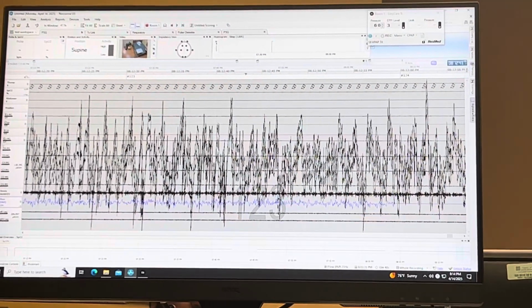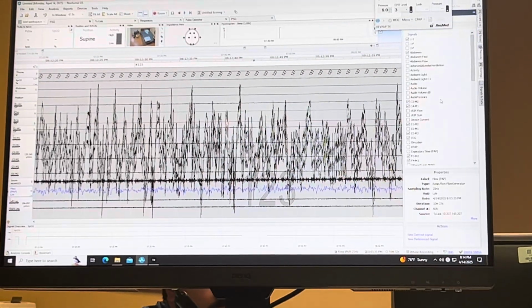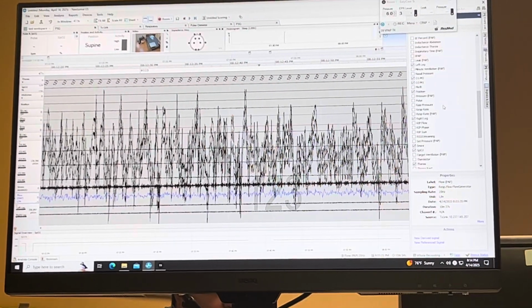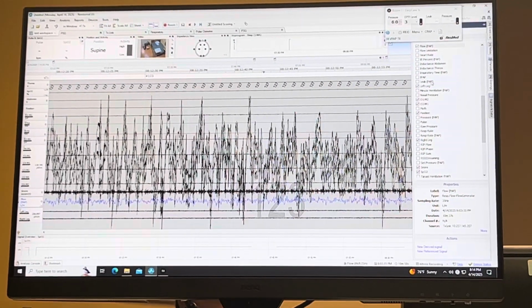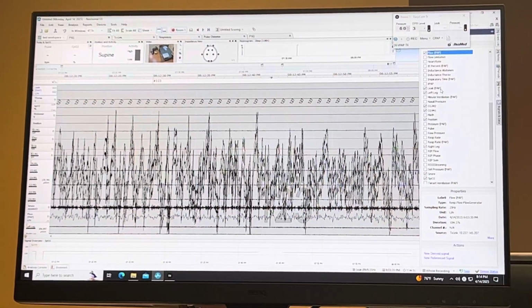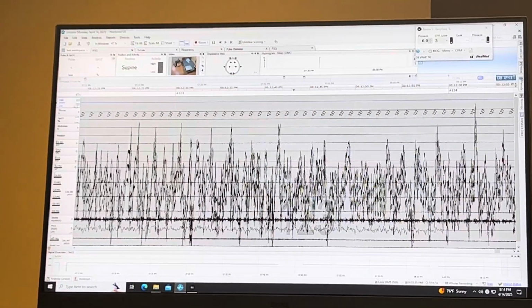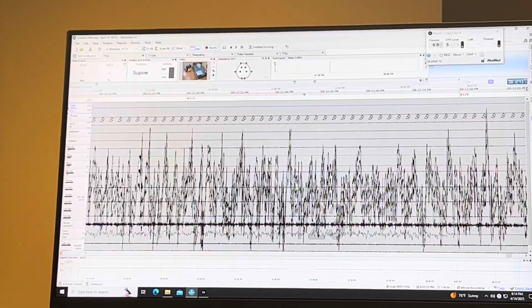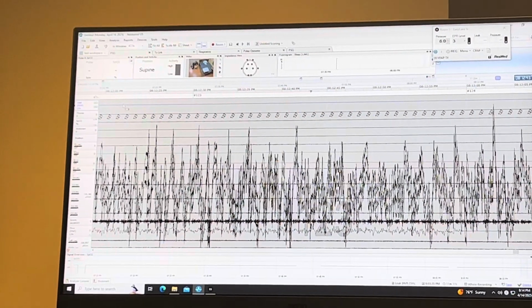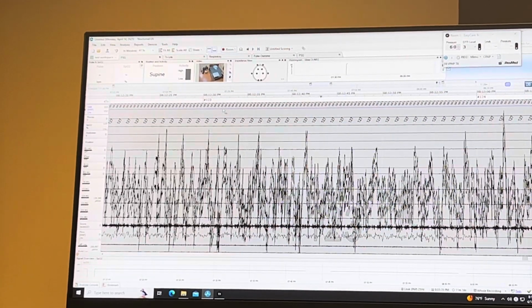Okay, so you can come here, signals and data, and then we find it, it's in alphabetical order. So leak, parentheses PAP, so it means coming from the CPAP. It's gonna add to the top of the screen, but again, there are no settings attached to a thing you're adding, so it's just a line. If you want the numbers, right click, show values.